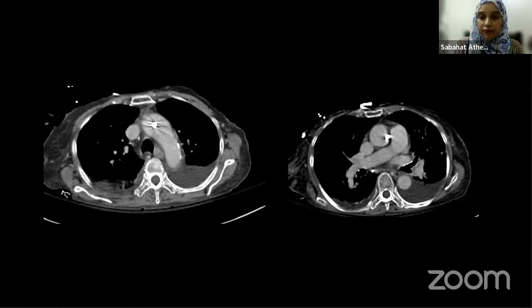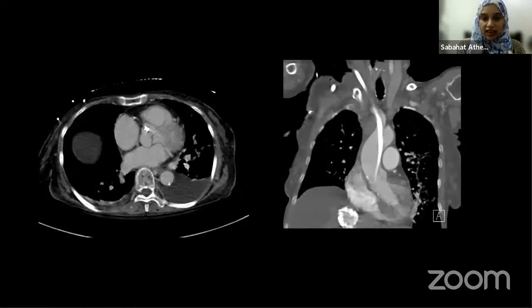So basically, when we were doing the ultrasound, we were also correct that in the neck, the catheter is in the vein, but the ICU physician was also correct that he's getting arterial reading. This is arterial. So basically, the catheter went into the vein, but unfortunately, inadvertently, the vein got punctured, went into the artery till the arch of aorta.